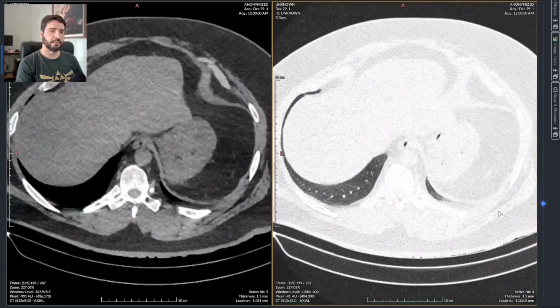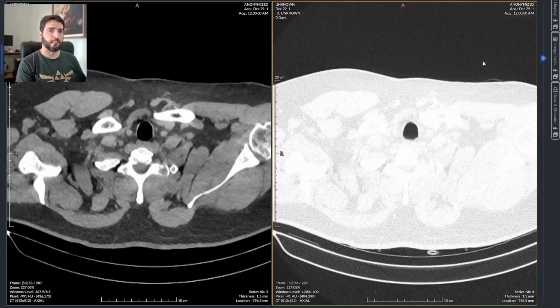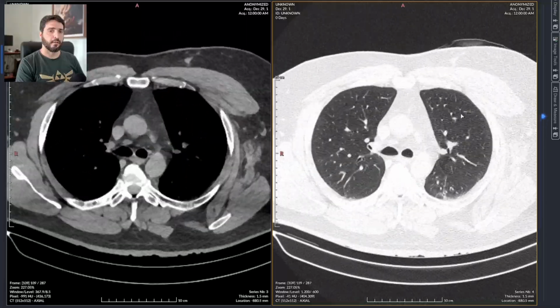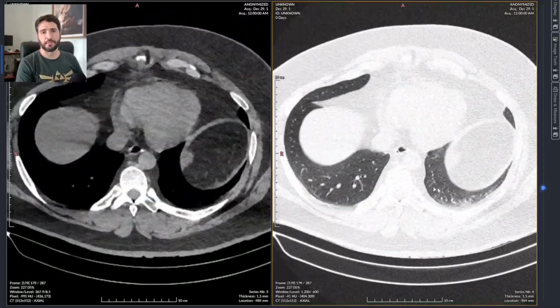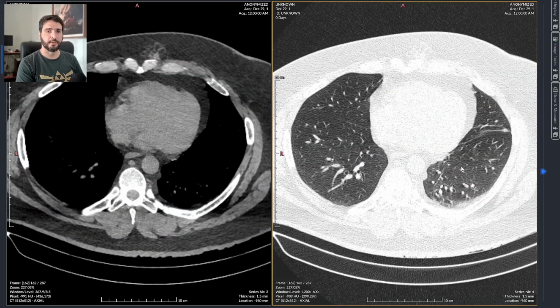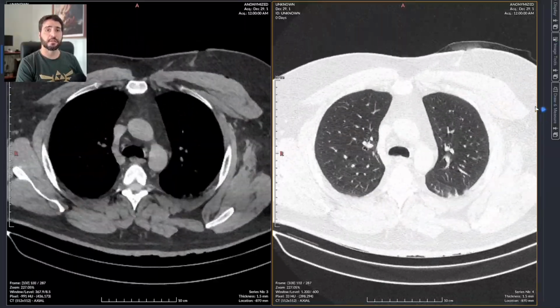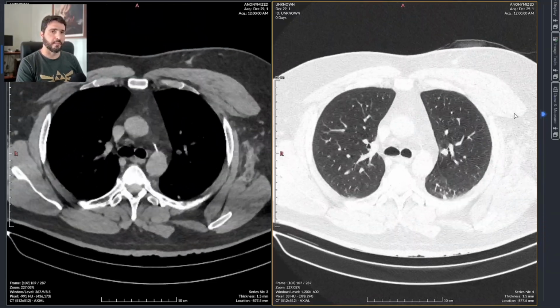This could be due to lying down on the stretcher for far too long, or because he was hit many times by blunt force or any other trauma to his back, which caused mild pulmonary contusions. But this is just mild. This is really nothing much.